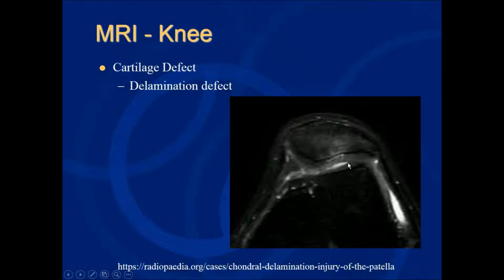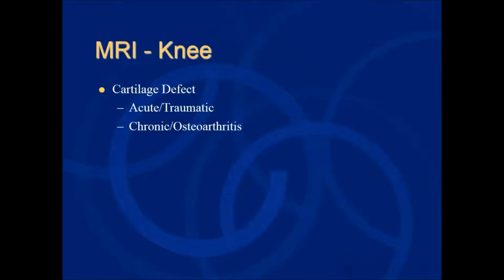This arises from usually shearing traumatic forces which shear the cartilage off of the cortex itself. Sometimes they convert to a flap morphology, in which case there would be a fluid cleft that would extend into a defect here and then along the cortex here. You can refer to those as flap tears.